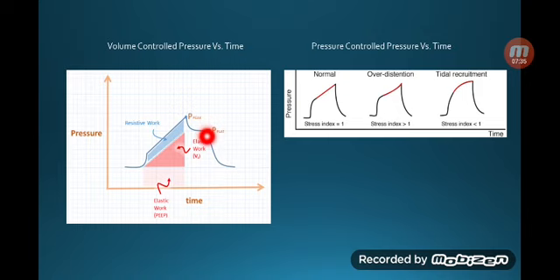What does that mean? Why is that important? Basically, the delta P, which is the difference between the peak pressure and the plateau pressure, gives you an idea about the resistance you're dealing with, which might be related to the lung status if you nullify everything else, but actually you can't.